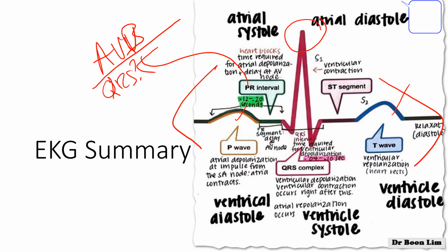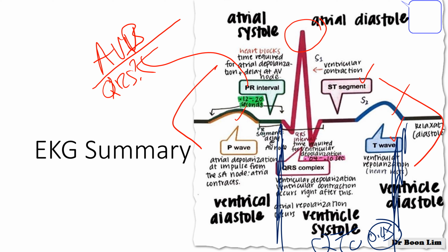And then P wave morphology, T wave morphology, we're not really focused on. T wave inversion, ST segment stuff, that's more MedSurg 3. But QT, that is important to discuss, right? We have the QT all the way down here. QT is important to figure out if they are at risk for torsades or not, which they are if their QTc is prolonged. Greater than what? Greater than 0.45. Okay, and PR interval greater than 0.2, right?